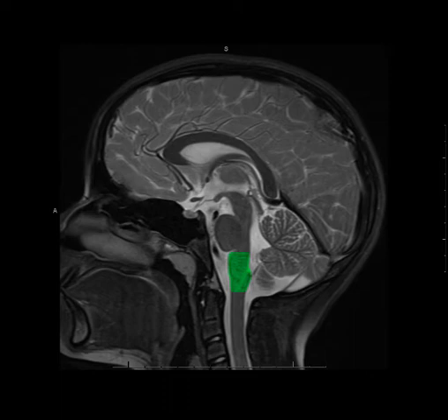The most interesting thing, anatomically speaking, on the midline sagittal image is along the posterior aspect of the medulla, where there's a little shelf-like outcropping that represents the obex, and the obex is the site where the central canal of the spinal cord originates. You can see it faintly outlined here with arrows as it extends through the lower end of the medulla into the cervical spinal cord region.